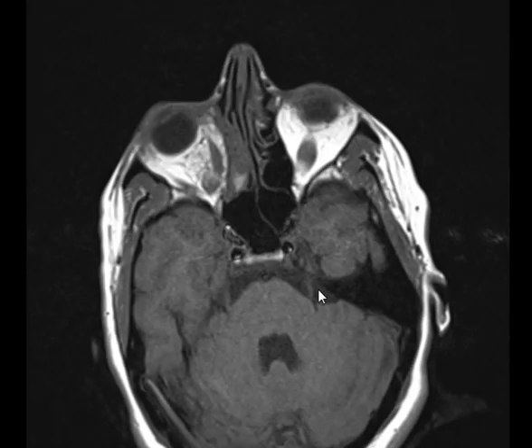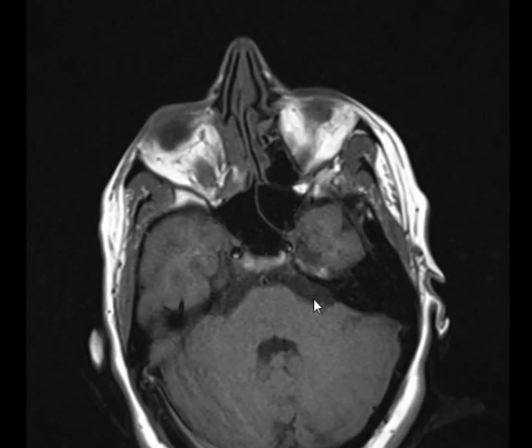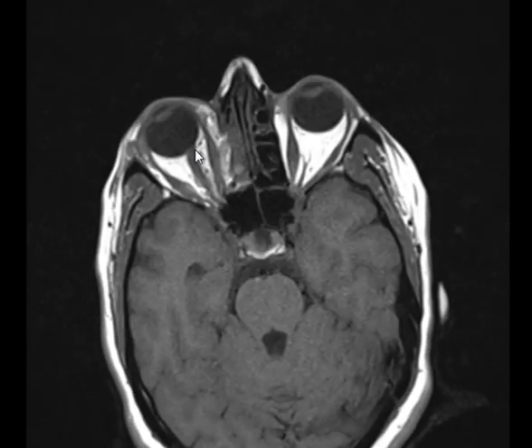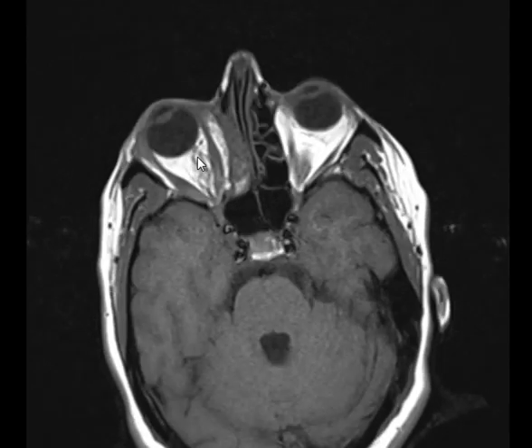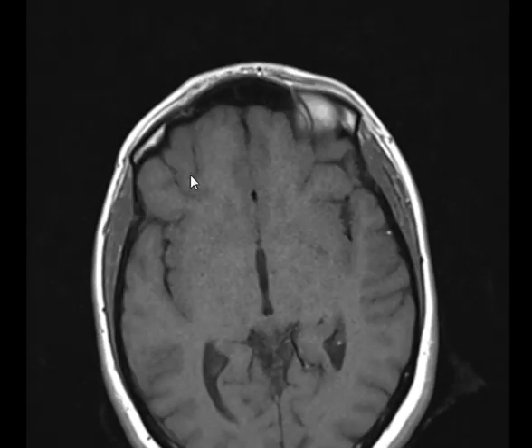Is it axial, coronal, or sagittal? Axial. T1, T2, or fat sat? T1, without fat sat. Good. We are going somewhere. First of all, what catches your eye? The right eye. The right orbit. What's going on there? There is abnormal signal intensity. Nice.